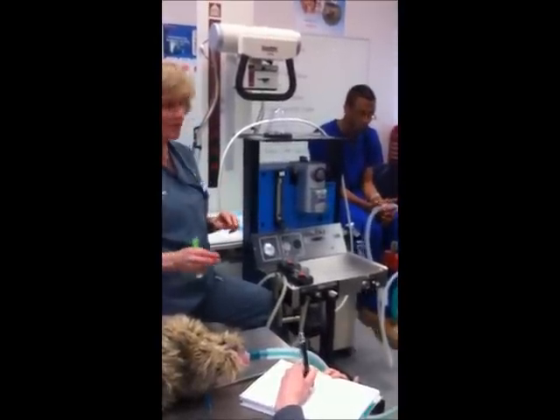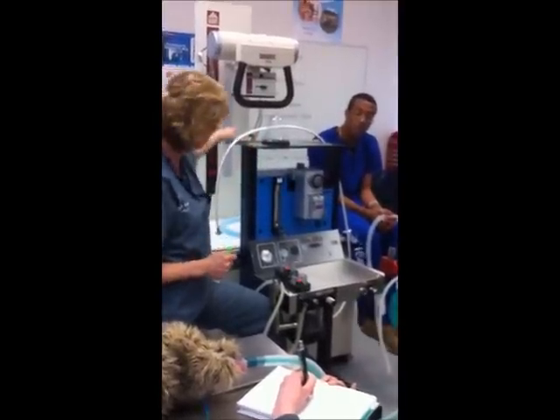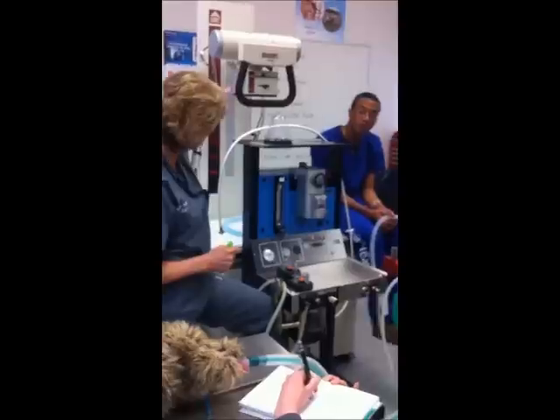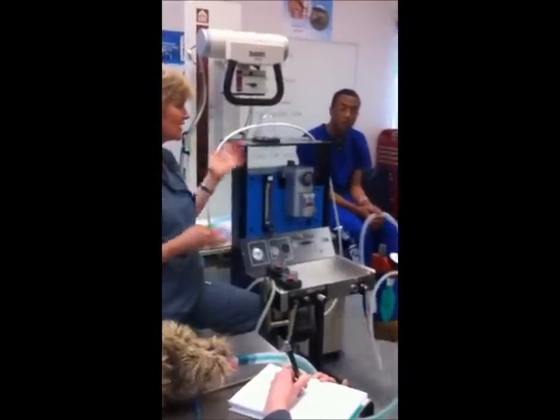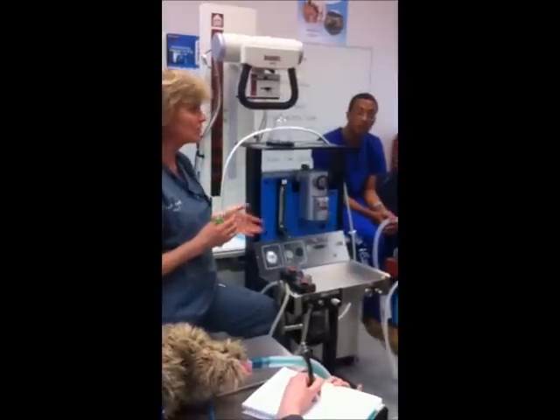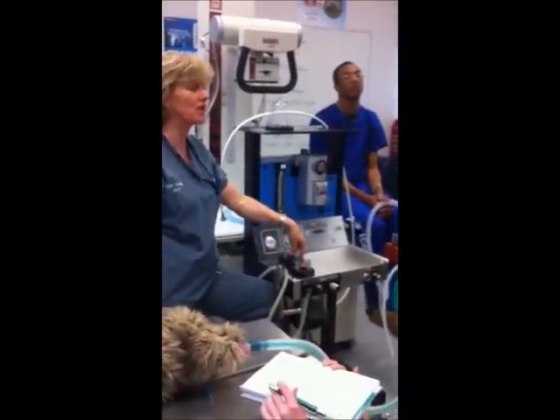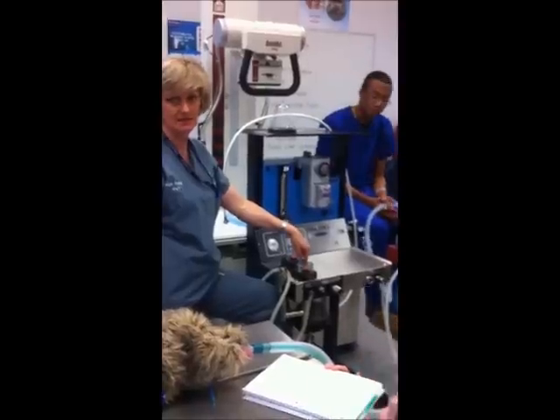The next part of that practical, you're going to be given 4 cards, 4 only. And they're going to have one of those 11 things on each of the cards. That's when it's important that you understand flow through the machine. And why that's important to me is when you get out, I cannot promise you that you're going to get a machine that looks like this.